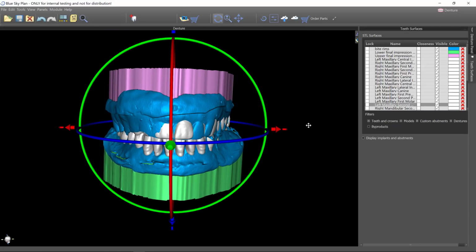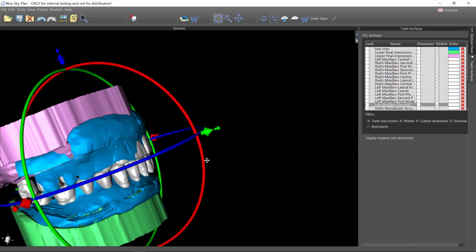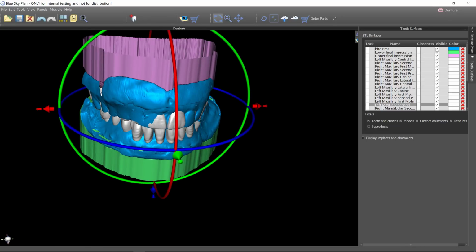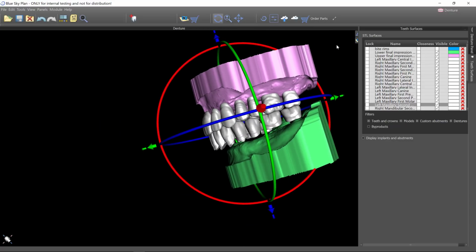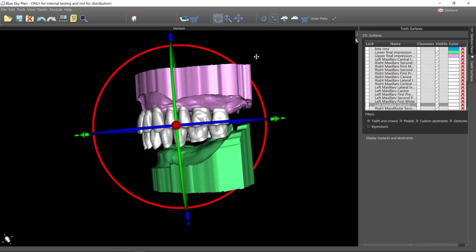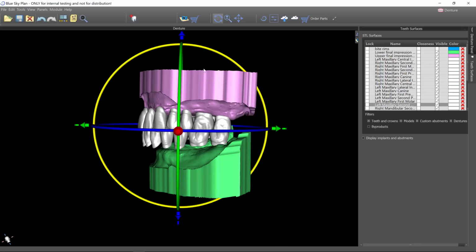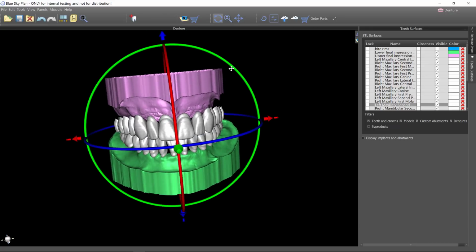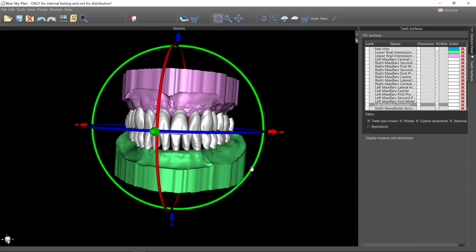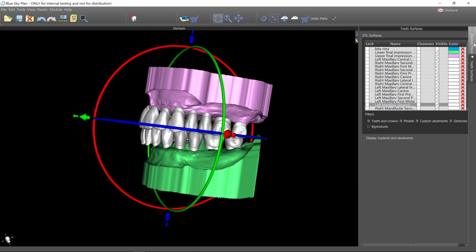And then the occlusal plane, I did not trust whatsoever on this particular patient. It was somewhat of a roller coaster with that existing upper, and so I'm going to orient that more just by eyeballing it. You've got numerous anatomic landmarks that you could use. You could say your occlusal plane wants to go from incisal edge to two-thirds up the retromolar pad. If we're doing that, we might want to put it about right there, and that would give us a proper occlusal plane. That looks about right, like what you would expect in between these two edentulous arches. So let's go ahead and go with that.